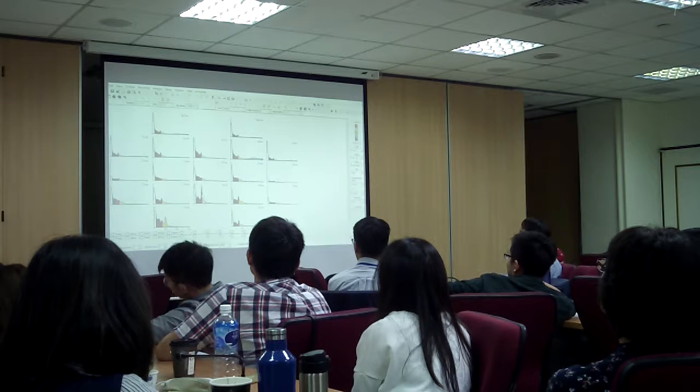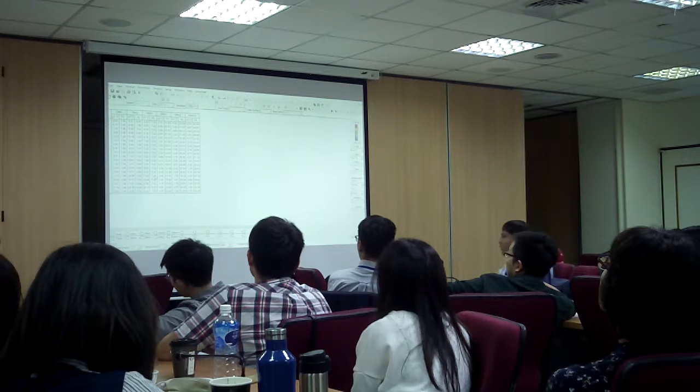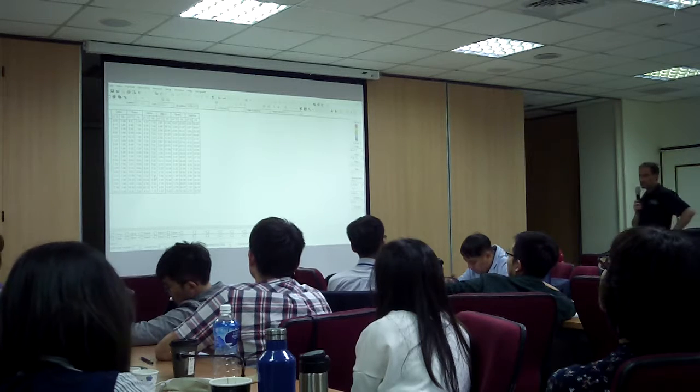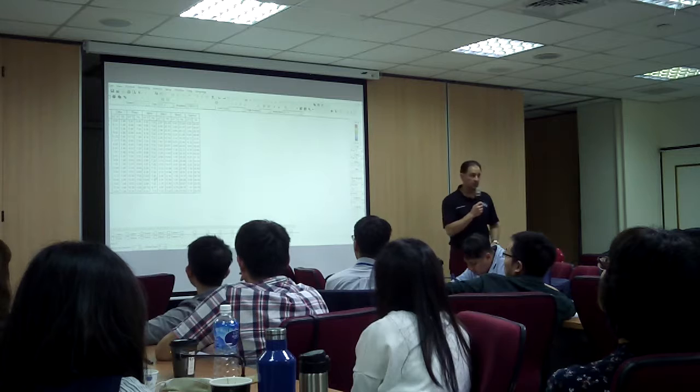When I told you that when you see really slow theta, it starts dragging the alpha on the dark side of the force. Takes it the wrong way. Look at the peak alpha frequency, 7.32. He is 12 years old. Is that problematic? Yes. Should we pay attention to it?